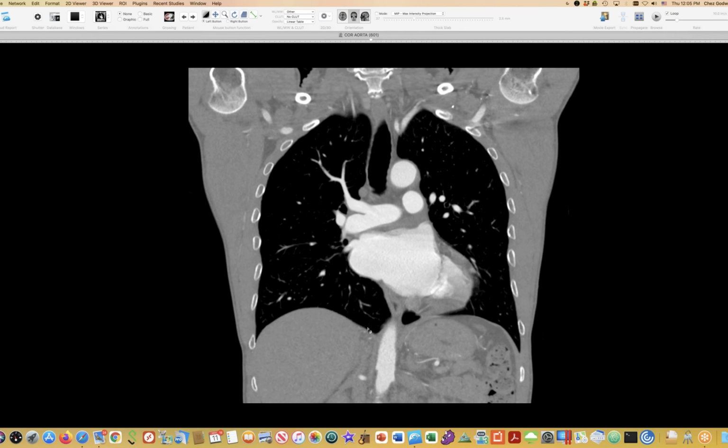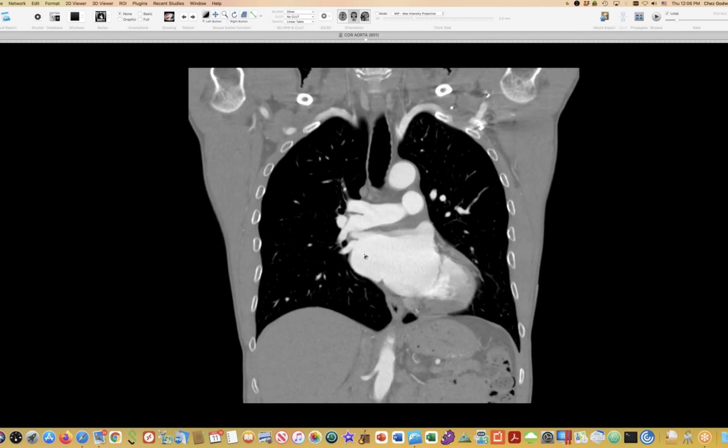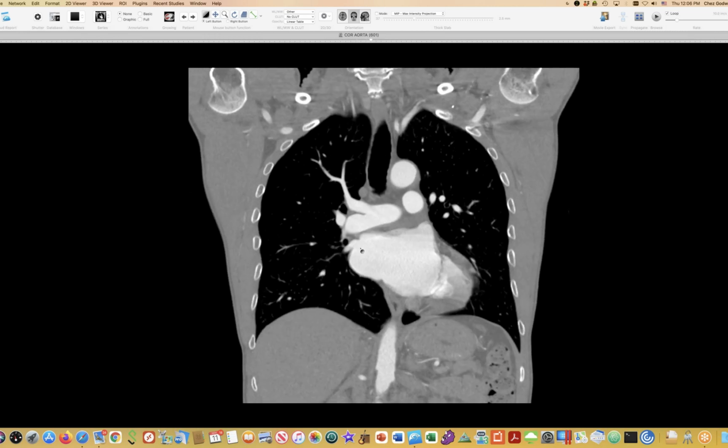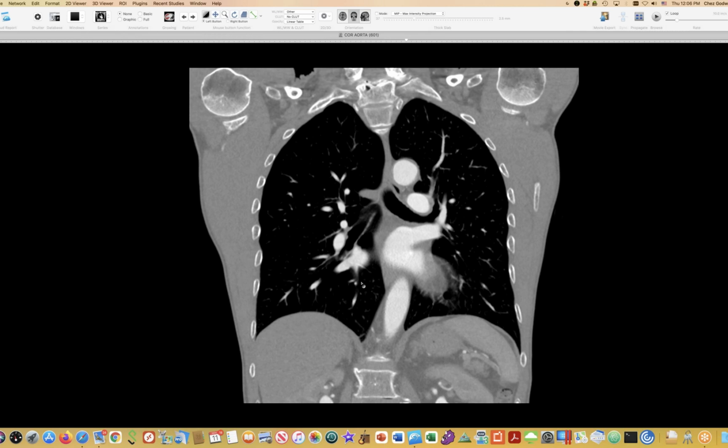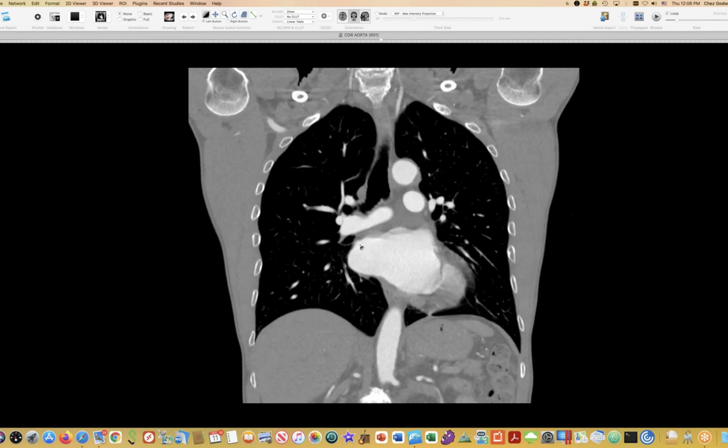What are you saying, Howard? Is it really a pulmonary vein varix, or is it just a funny bulge of the atrial wall rather than the veins so much? Yeah, I think that's a good point. I think that it's general dilation. I mean, the veins are kind of fat, but it's not a distinct venous bulge. It seems to be the atrium itself. I think that's actually a better assessment. This is just part of his big left atrium. Yeah, I like that. It's really what gives rise to the vein, but it's more on the way to the vein than the vein itself. Good point. Okay, but kind of a cool thing on the chest radiograph.